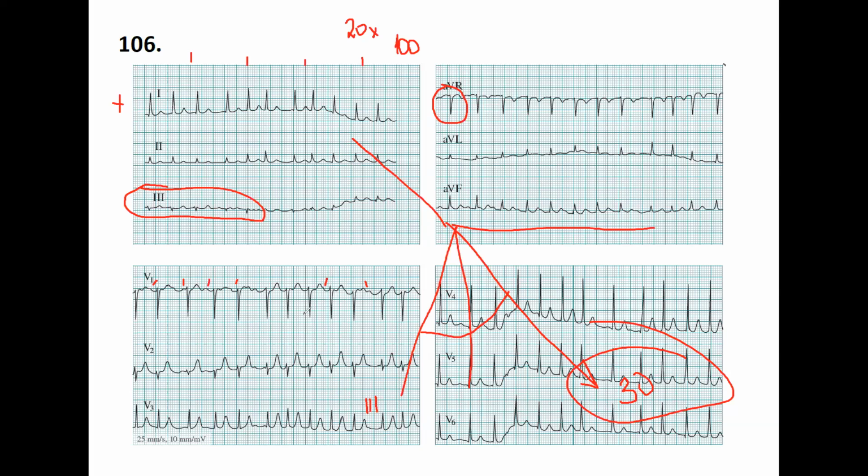So don't rush. But is this then atrial fibrillation? No. Again, this is the next seminar. Atrial fibrillation means arrhythmia without P waves. There is no P wave. I will show you that tracing, but that's next week. Step by step, as an old saying goes.